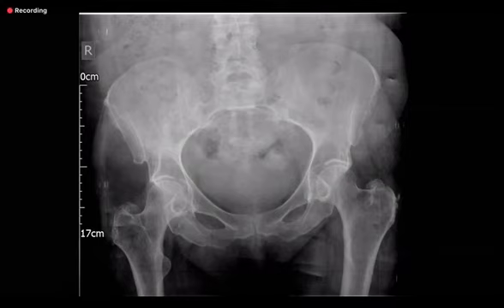Right. Okay. Anything else on this film?